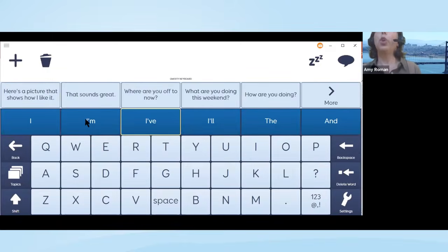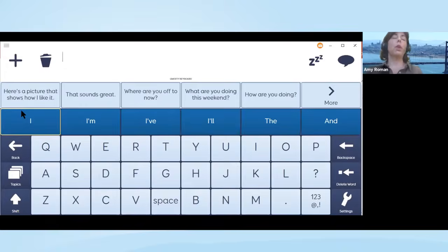And let's look at these. These are word prediction. Word prediction I find really, really useful. I use it, and my patients really like it. It's also got next word prediction, so this system will try to predict the next word you're using based on the last word. That's fantastic. And up here is chat history.